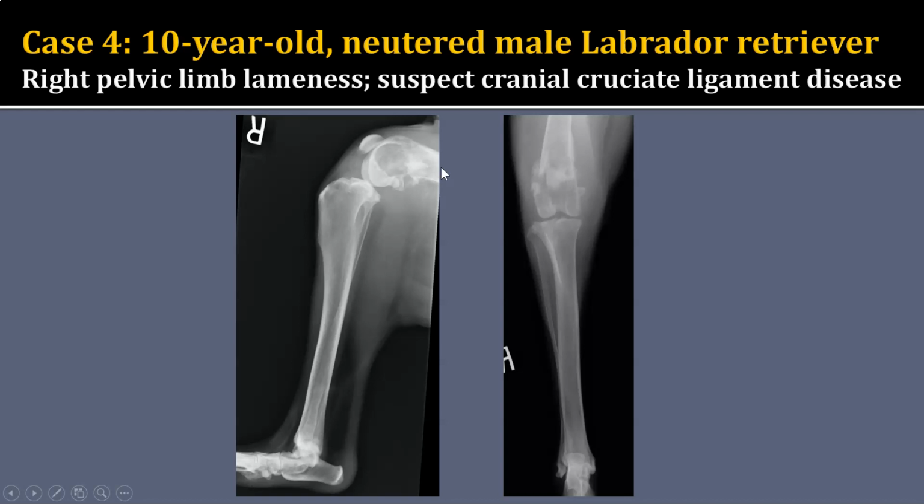Now, could this be fungal osteomyelitis? Sure, that is possible because it does like to be in the same places and can still affect just one bone in the area that we're looking at as primary bone tumors. But I just think that that is unlikely in this 10-year-old dog. This is not a joint-related tumor because the lesion is in the distal femoral metaphysis. It is not related to the joint margins, not periarticular, and there are not more than one bones involved.